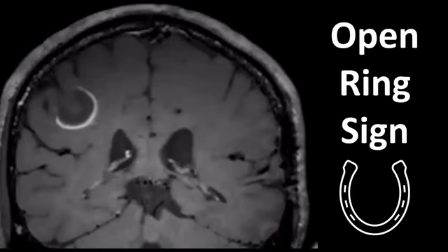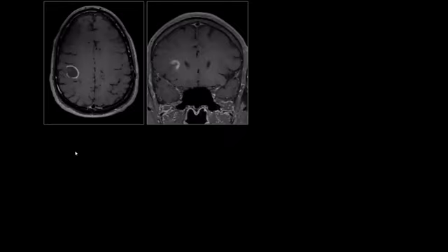The next sign that should make us think demyelinating disease is the open ring sign or the horseshoe enhancement sign. And that is something we typically see in demyelinating lesions. So here we see a T1 weighted image with gadolinium. This is a demyelinating plaque located along the cortex. So it's a juxtacortical lesion. And we see the typical open ring enhancement with a rim of enhancement located towards the centrum of the brain or located medially. And for comparison, a few other demyelinating lesions.